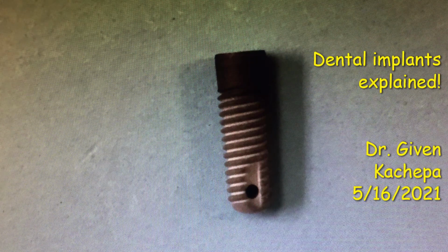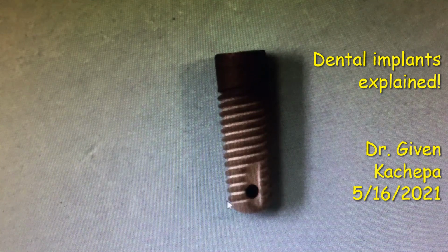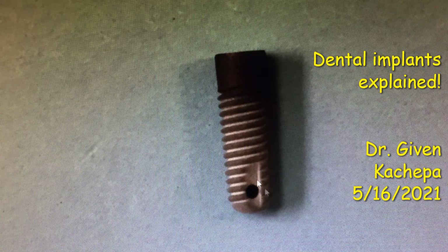In this video, I want to do a case presentation on dental implants, what dental implants are, who is a candidate for a dental implant. Here's a model that we have here in the clinic.